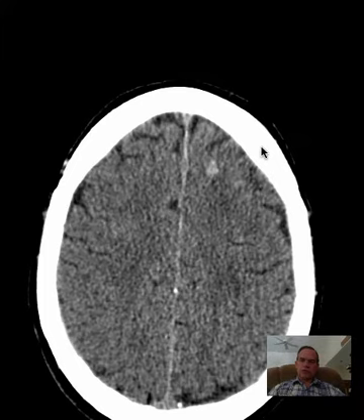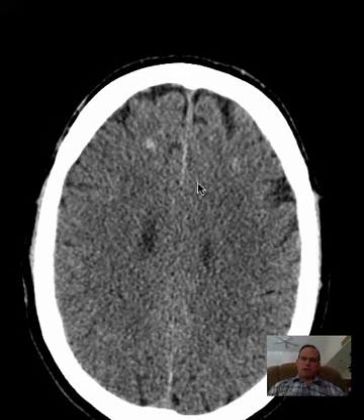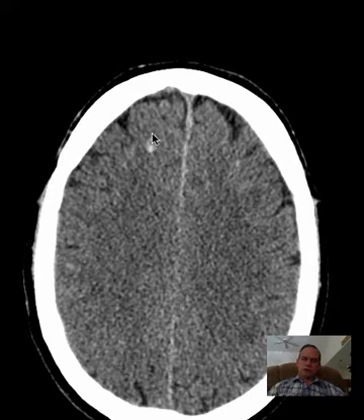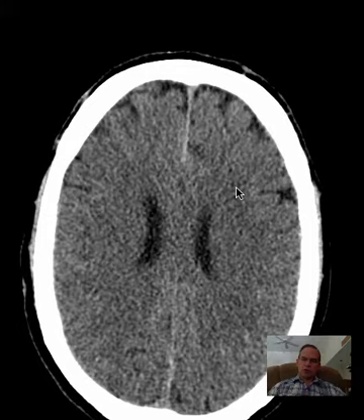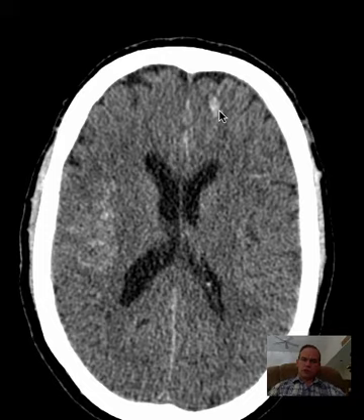It is posited that the etiology is the differential density of cortex versus white matter, and therefore there's a different deceleration for the gray matter and white matter, and therefore at the interface there is a tearing effect. And so you can look here, that's gray-white matter junction. This certainly is.